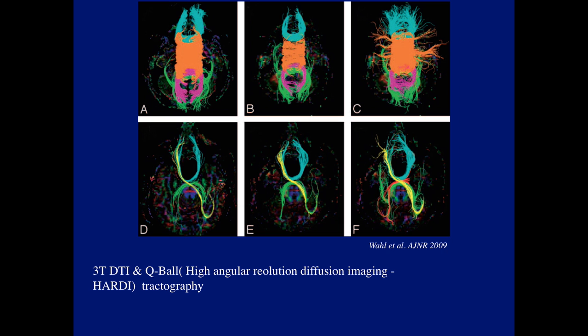And amazingly, there's very complicated tractography, and in patients with a partial agenesis of the corpus callosum, they actually tracked fibers which did not end up in the expected location. For instance, this was called homotopic distribution, where the fibers go from one frontal area to the opposite frontal area. But they found that some frontal fibers end up in the posterior parietal region. So as DTI and tractography get more sophisticated, there'll be much more precise topographic analysis of the fiber location on the corpus callosum, and also the variations between populations.